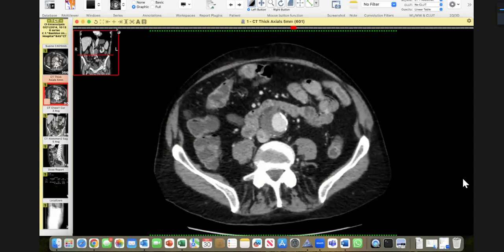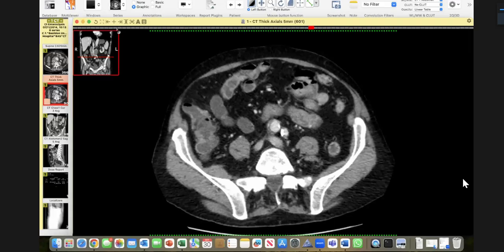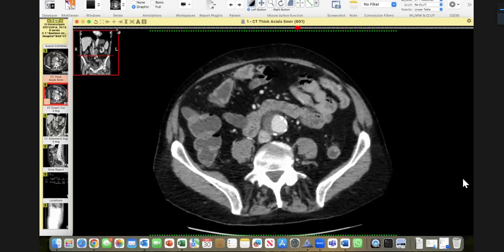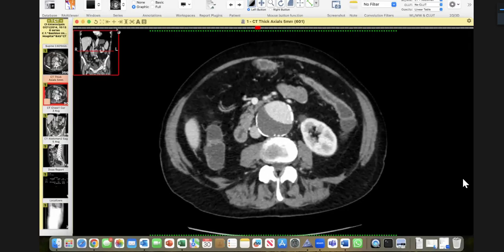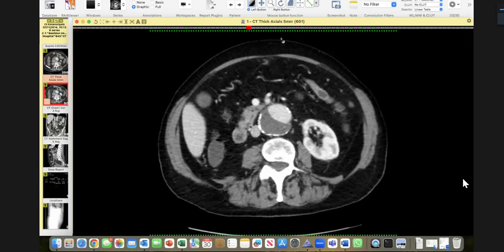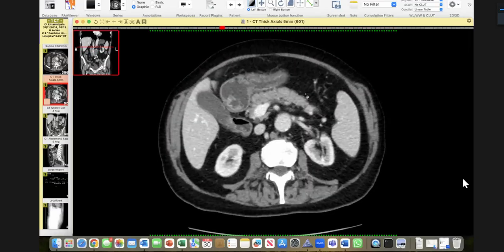I'm not interested in the aorta. The patient has got epigastric pain. Please concentrate on the upper abdomen. Sir, I'm scrolling and it's going a bit slowly. I'm going upwards again. Let me scroll cranially for you. Sir, I've left it.